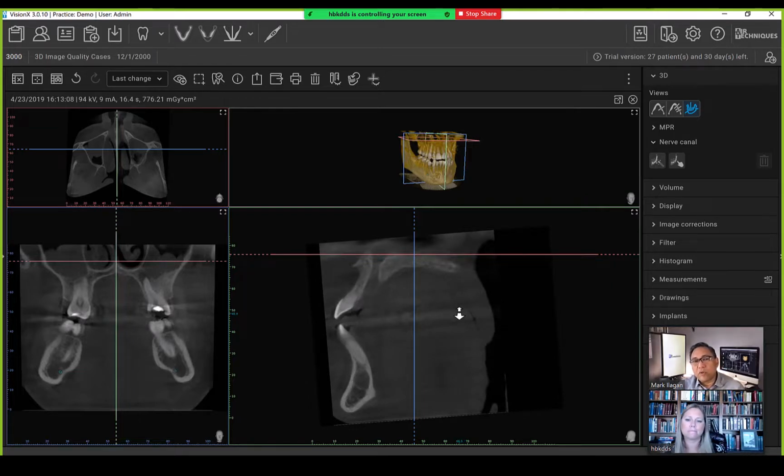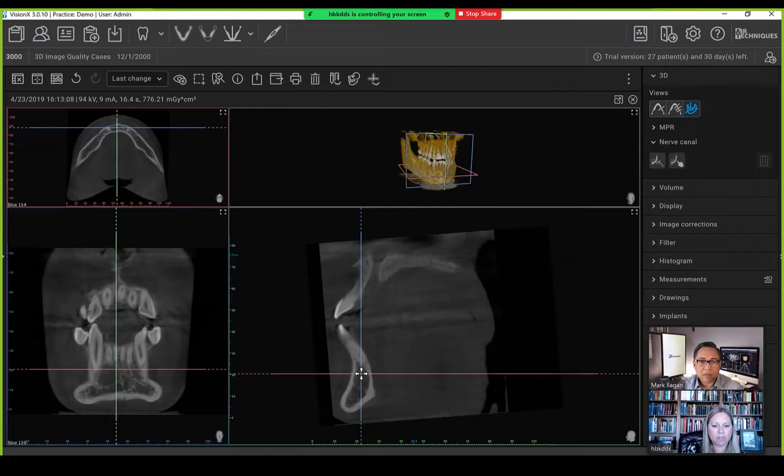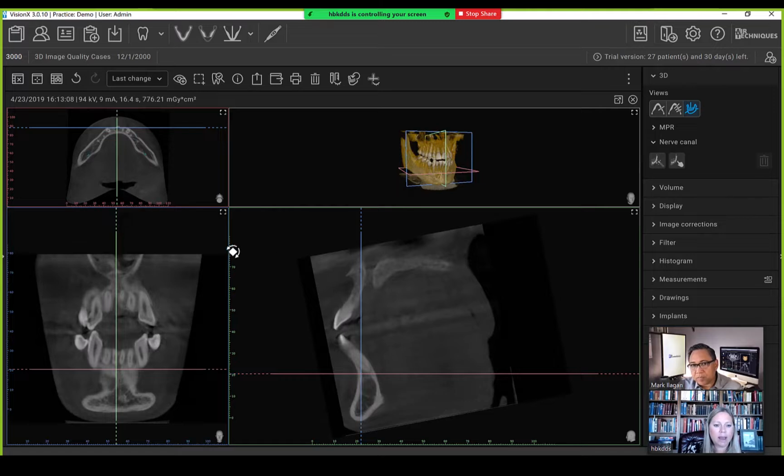So for the report, you write all this out? Is that what's to be expected from a report? I usually, anything that I've talked about, I'll go ahead and write out. Definitely we would come down and spend some time with this little lesion down here. Would you measure that usually? Yeah, I'm going to measure that. I want to discuss it.